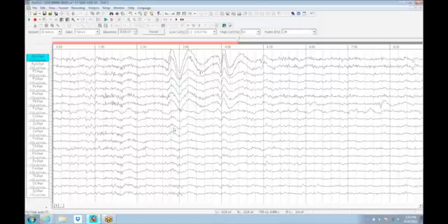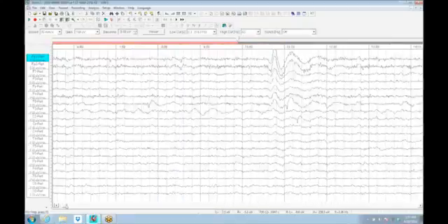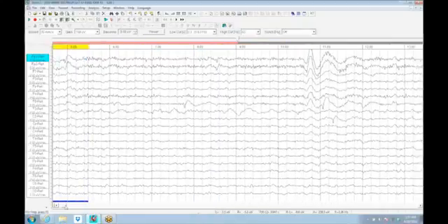Now, typically for QEEG processing, you'd end up wanting to remove sections of the EEG, like the eye movements that we see here. That can be done manually by clipping out or erasing sections of the EEG. If you clip them out, they're not going to be analyzed, but you can still see them. If you erase them, it'll collapse this across, so this will be gone. It's preferable to simply mark them. Those marks can end up being changed at another point, but if you erase it, it's irretrievable.